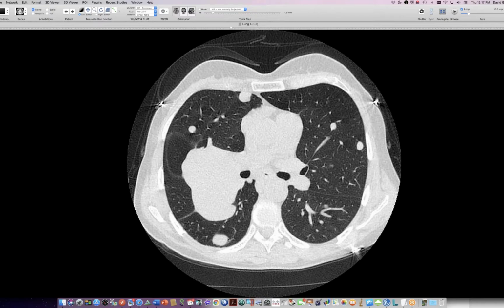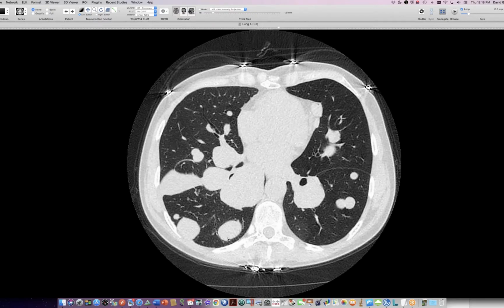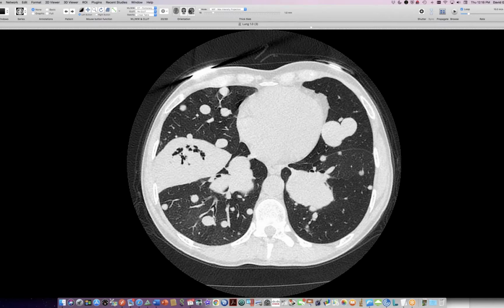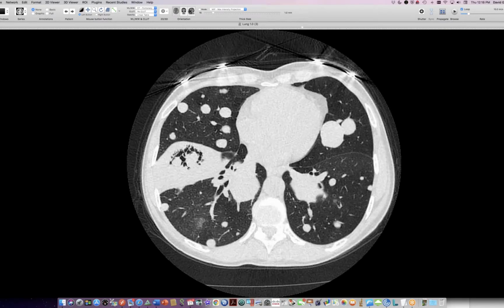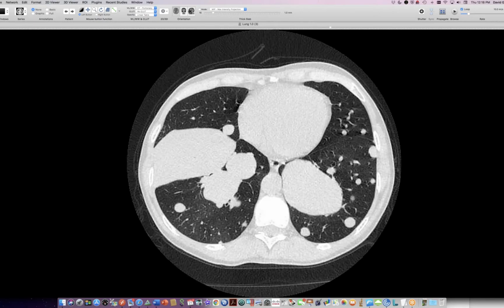Now, there is a possibility that these lesions can degenerate into leiomyosarcomas. And so when you see this strange looking lesion here, that would be a possibility. I don't know whether that has been pursued. I'll try to get more history for next week.